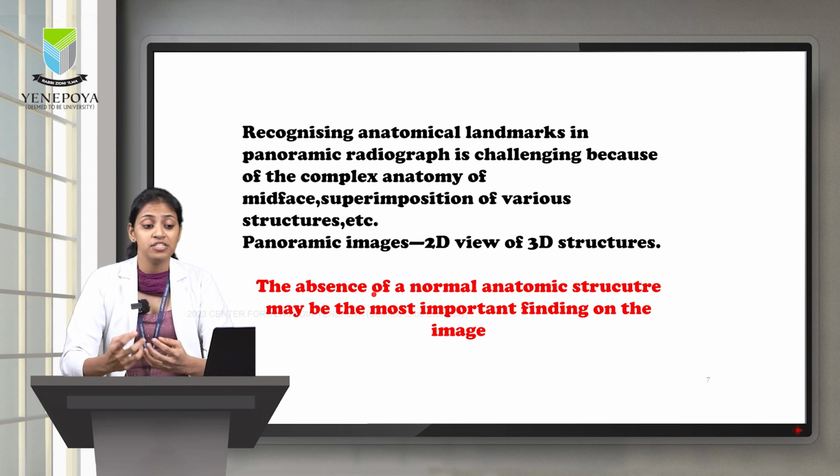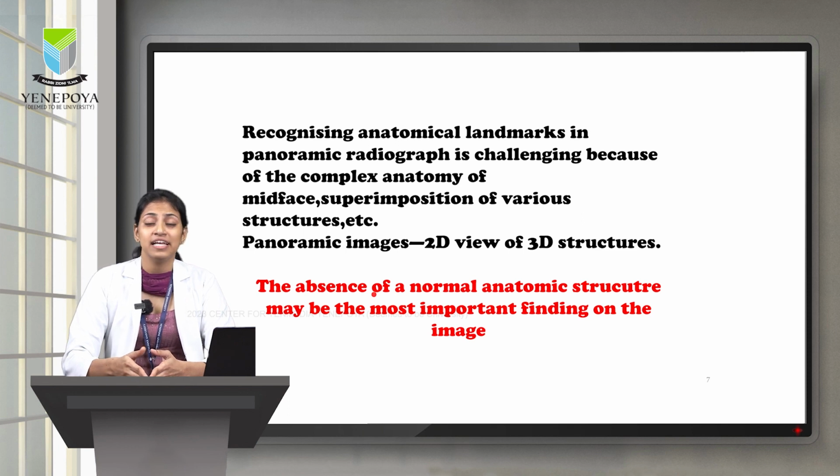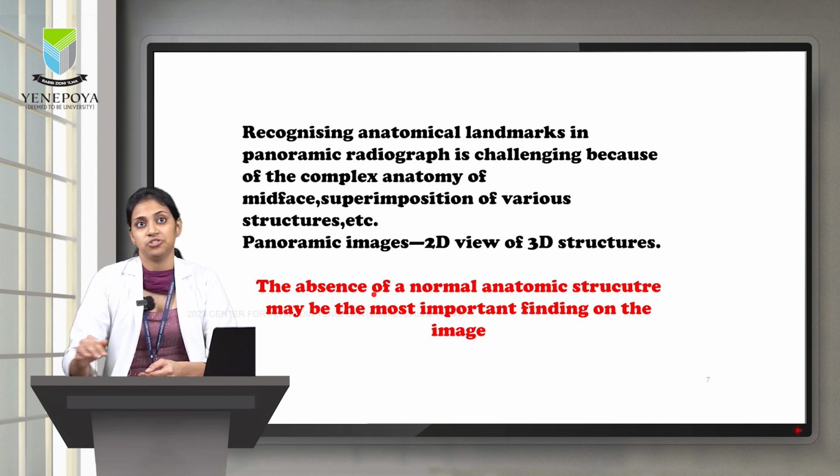However, we always need to remember that not all the anatomical landmarks or the structures necessarily appear on the panoramic radiograph. There may be variation between individuals and also anatomic features can change with time. The absence of an anatomical landmark may be an important finding on an image.